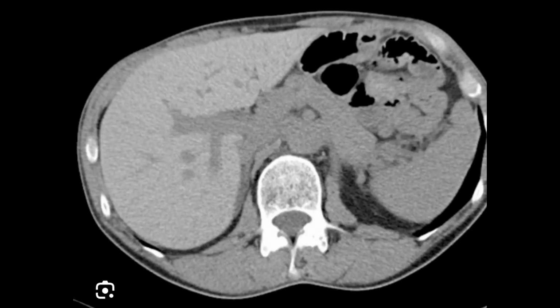But with ultrasound imaging there is confusion, as you may confuse it with hepatic steatosis. So therefore you must jump onto a non-enhanced CT. There is no need for putting any contrast, just take it straight away without contrast. CT without contrast for the liver region is required. On the non-contrast enhanced CT, you will appreciate a diffuse increase in attenuation of the liver parenchyma.